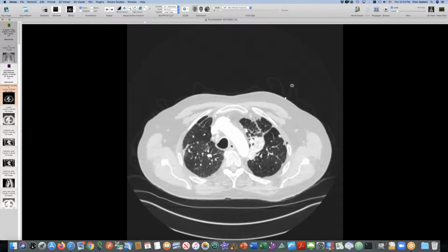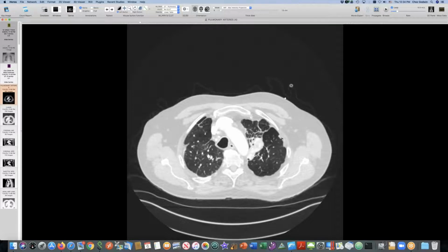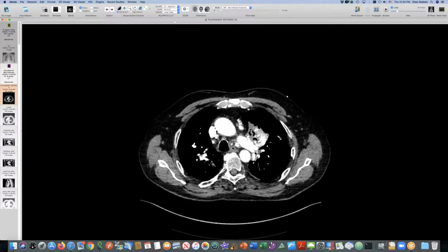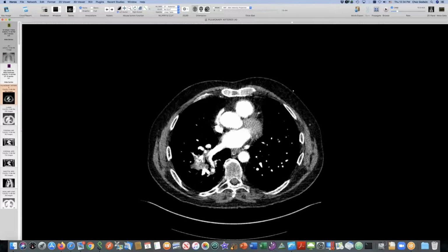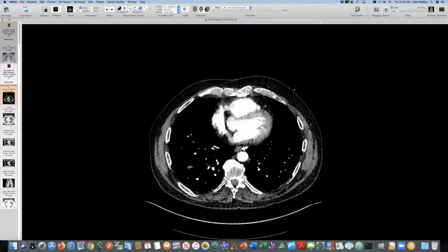And sometimes these subpleural opacities extend into fissures. So sometimes I've seen little fingers coming into the lung in association with these peripheral subpleural lesions. And again, this suggests to me that this case, which is called sarcoid, is really silicosis. So we have this high attenuation stuff here, and then we have some high attenuation material in paraesophageal lymph nodes again. And so this, I think, is silicosis.